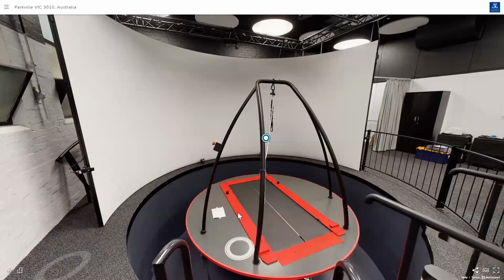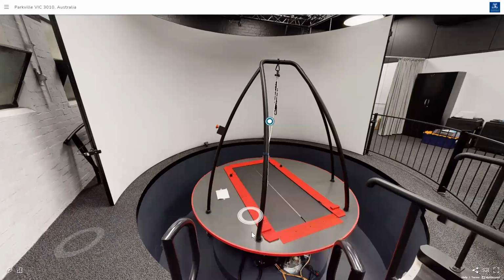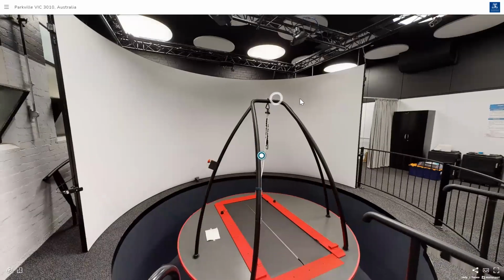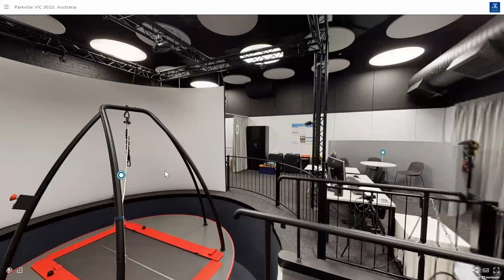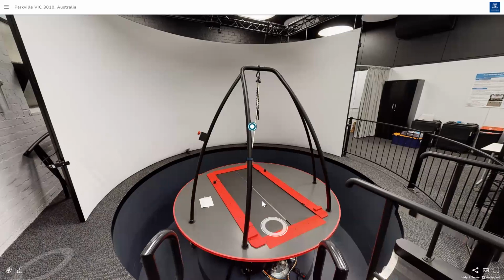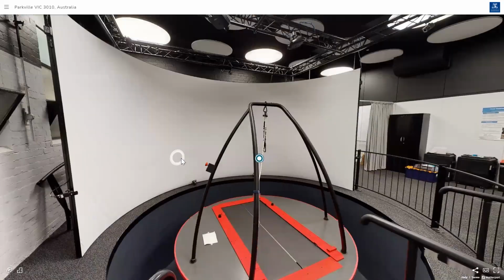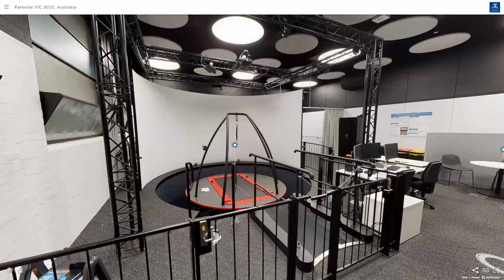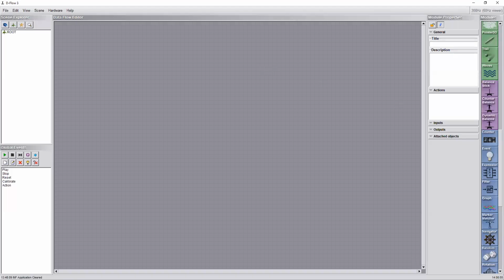It is a 6 degree of freedom platform or robotic system. And this VR can change, and these cameras can help you get, for instance, the motion of a person standing here. You can do all sorts of experiments. One quick application, for instance, that I can build here to show you what the possibilities are, and then you can keep watching our videos.